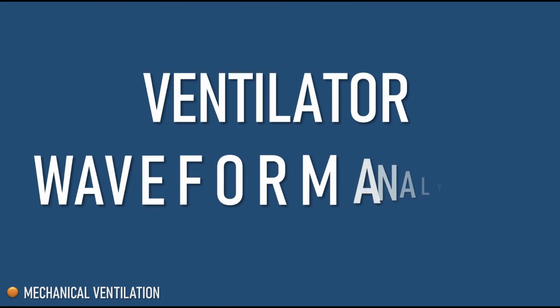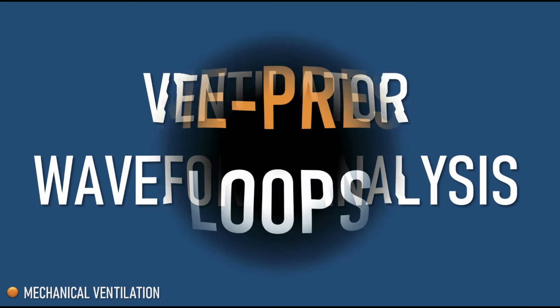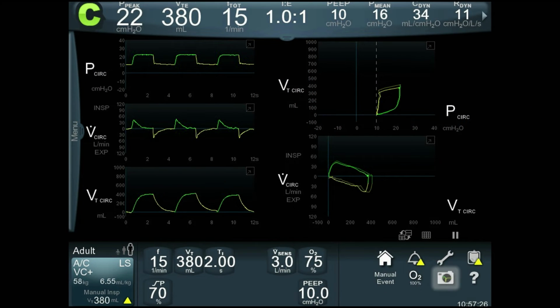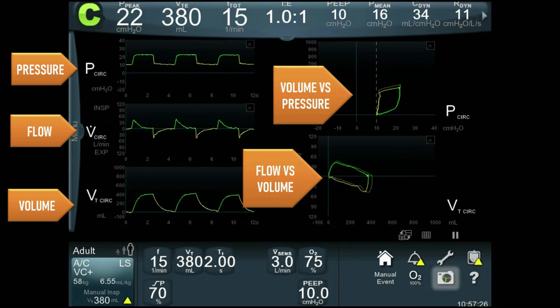This is part of a series on ventilator waveform analysis, and this particular tutorial is on the pressure waveform and volume pressure loops. You will recall that I like the Puritan Bennett ventilator screen to look like this. On the left hand side we have waveforms, on the right hand side we have loops, and those waveforms are pressure versus time, flow versus time, and volume versus time. The two loops are volume versus pressure and flow versus volume.